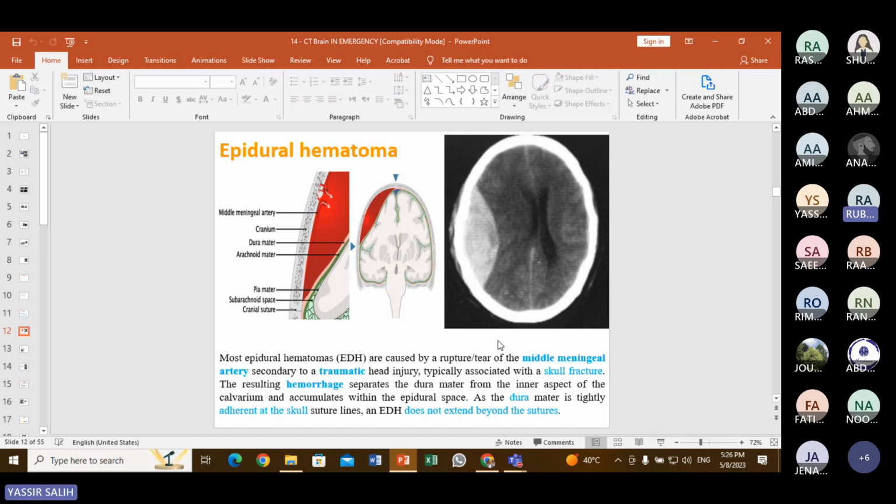Not without. Without contrast. CT brain or CT head without contrast. What do you see? Hematoma. How to describe this hematoma? What is the appearance of this hematoma? It's white. Yes. نقول نتذكر white. How to describe a white lesion on the CT? Hyperdense. Yes, there is a hyperdense lesion.